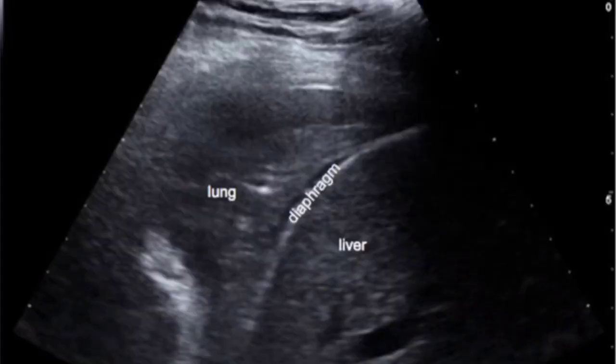Pleural effusion is commonly seen with lung consolidation, like you see in this image. You see lung consolidation. You can see a mass, the lung mass. Normally, you shouldn't see that if it's normal because of air within the lungs, but in lung consolidation, the lung is collapsed, so sound can pass through and you can now see it. So you can see different cases of lung consolidation.